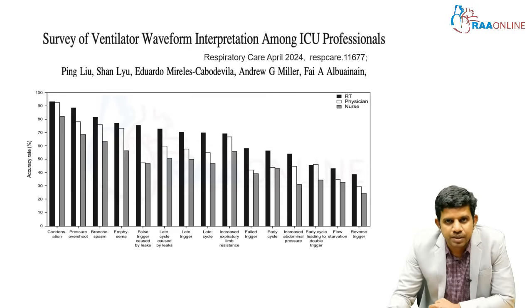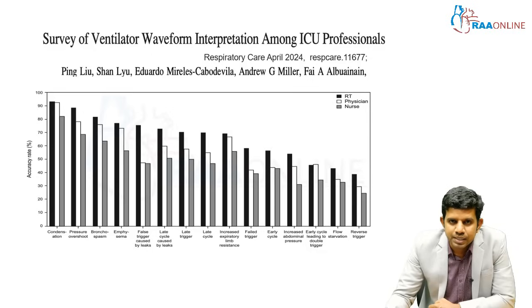Understanding of the ventilatory waveforms is very important to increase the success rate of ventilator related outcomes. But a recent survey published in 2024 found that less than 5% of ICU consultants understand the ventilator waveform appropriately. More than 90% of the ICU consultants, the doctors practicing critical care, are not able to interpret the ventilatory waveform appropriately. They are not making appropriate interventions whenever they face a problem with the ventilators. So understanding of the ventilatory waveforms is very important.